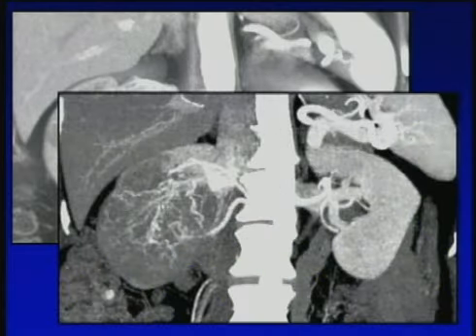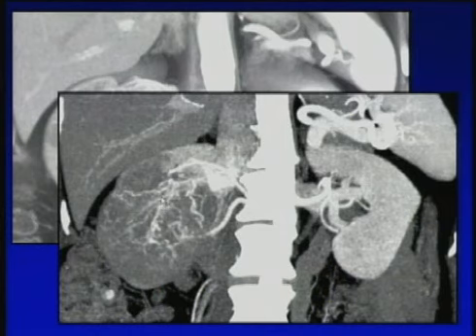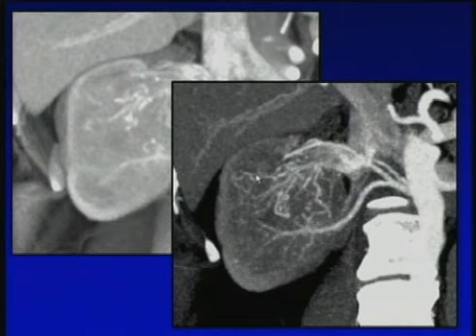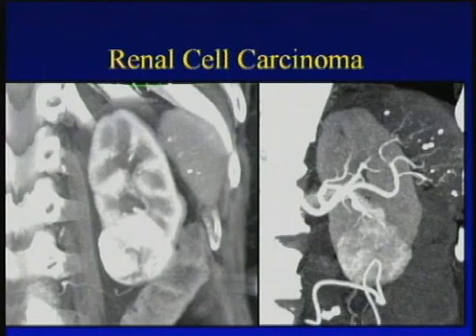Here it is on MIP, and MIP is the ideal visualization when you want to look inside the kidney to look for neovascularity. And again, you can compare the volume and MIP, but it's an excellent way of looking at neovascularity, and that's very important in surgical resection. Can patients get partial nephrectomy? Obviously, this patient could not, but also I think looking forward with this whole new chemotherapy, anti-angiogenesis factor, this becomes very critical for us to be able to understand how these tumors indeed behave.